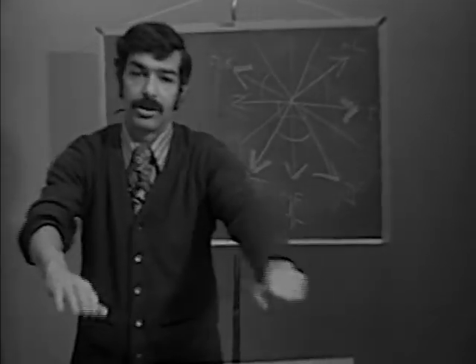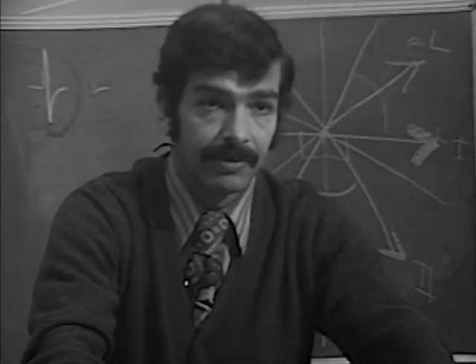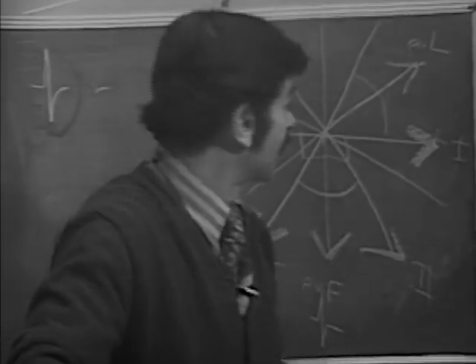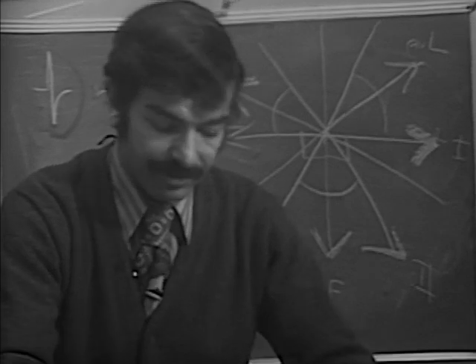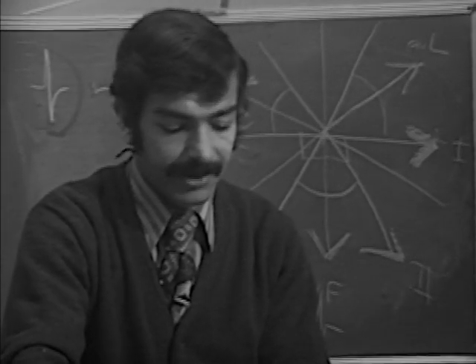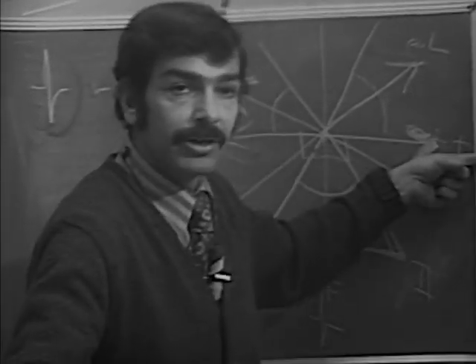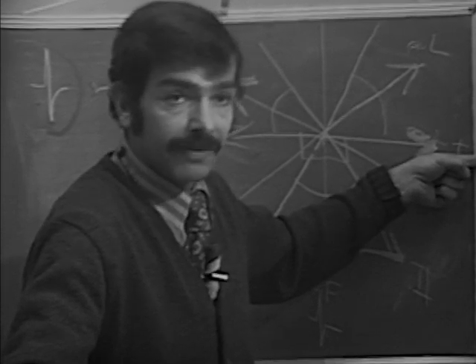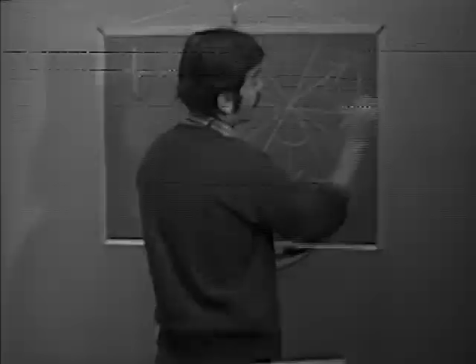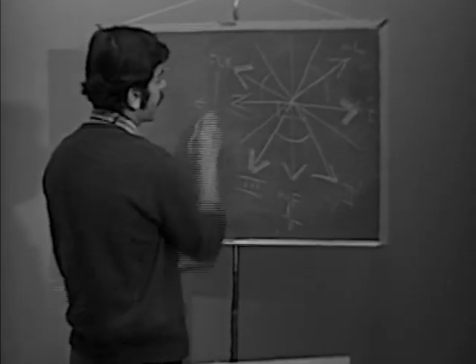So the next thing we do is we go back to our electrocardiogram and look at lead 1. Let's go back to make believe we have an electrocardiogram. We look back here, and suppose lead 1 is positive. Then our axis would be going in the direction of lead 1. If lead 1 was positive like this, the axis would be going this way. If lead 1 was negative, the axis would be going this way.